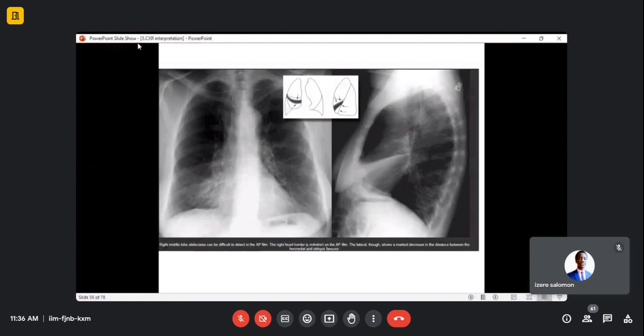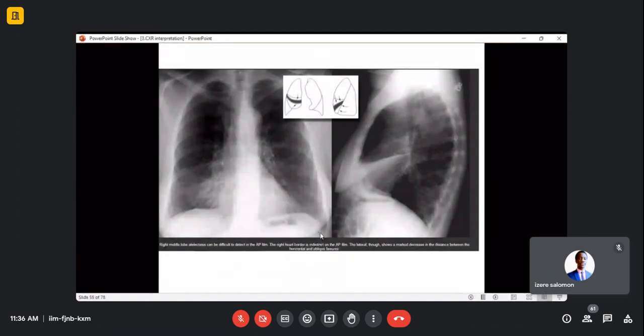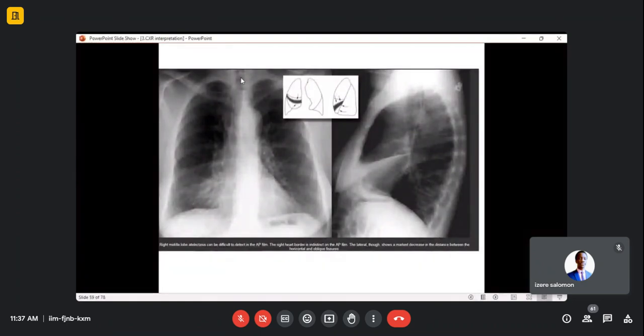The heart is okay, the left lung is fine, the trachea. Immediately, you remember I told you the approach is from the center, mediastinum, to the periphery: mediastinum, hilum, lungs. Can you see? Tell us. Yeah, I have seen that the trachea has been pulled to the right side.